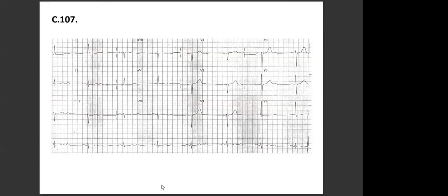I have 107. Okay, good. So it's not rhythmic. It's like it's rhythmic. Oh, it is rhythmic? Yeah, look here at the bottom. I noticed the last one was rhythmic, but then the other ones weren't. Yeah, because that's only a short. Here they changed the leads.